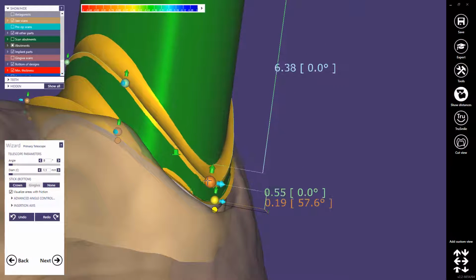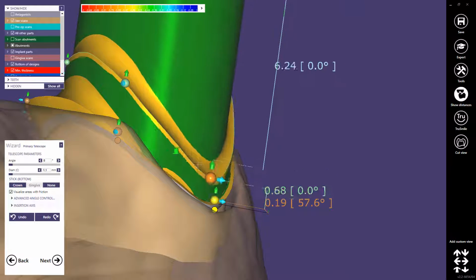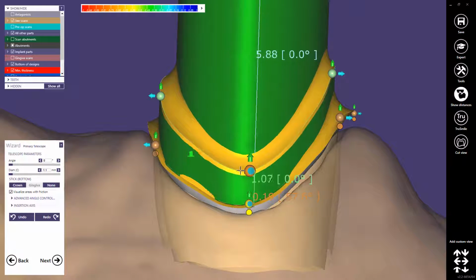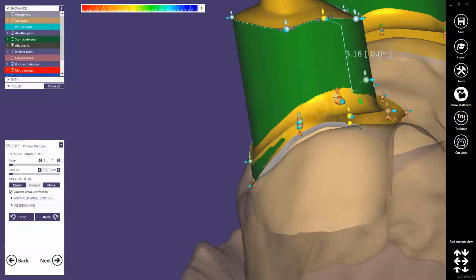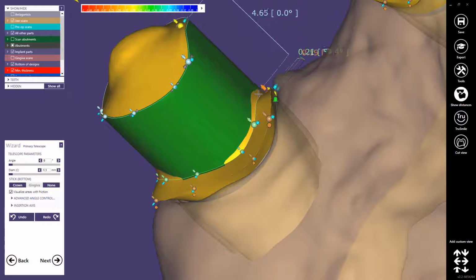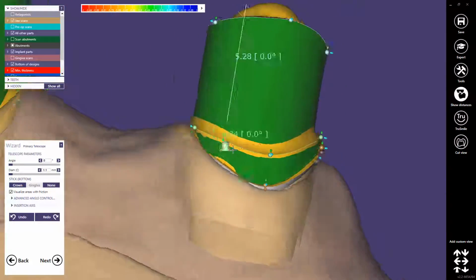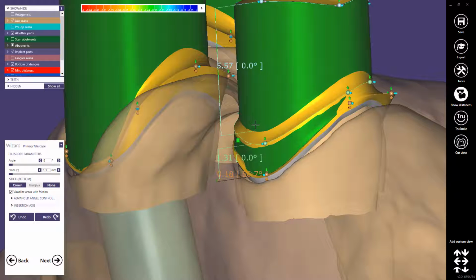And if you see, if I'm pulling this down at the end, this area will move outwards and will become thicker. Then I could create a kind of second area here, and on the lingual side it doesn't matter, so here I can pull it down again, completely down, like this. And now you could even change here the behavior of each friction area.